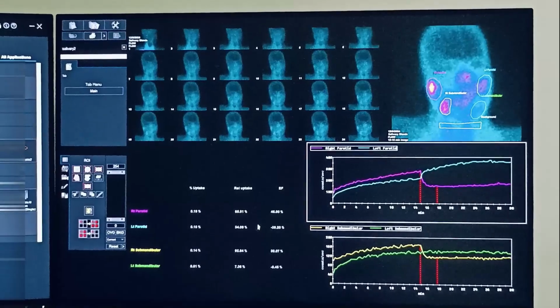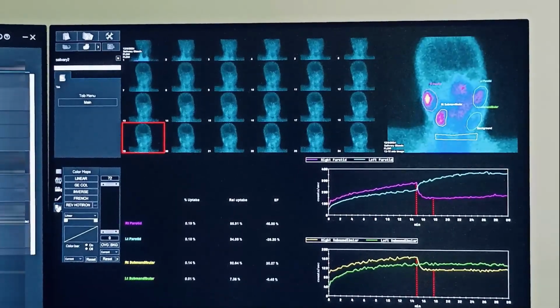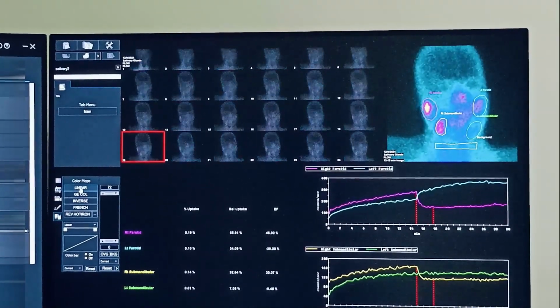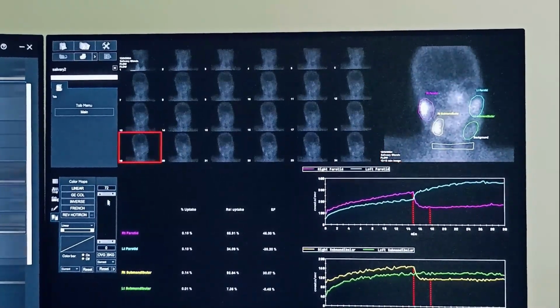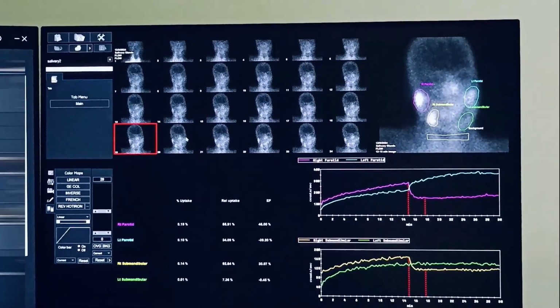So how then printing and all, how can you do that? For the printing we have an option here. For example, if you want to give black and white pictures on the paper, then we have a color option here. We can convert this to linear view and adjust the intensity using this slider.